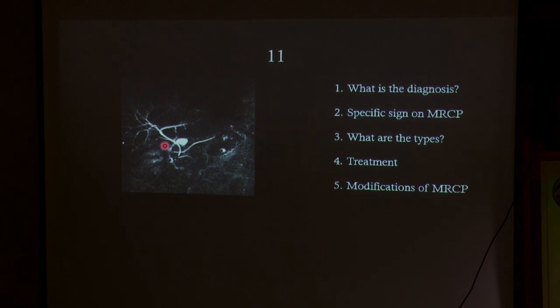So the next case, I provided an MRCP image. What is the diagnosis? What is the specific sign you are seeing on MRCP here? Yes, be loud. What is the diagnosis? Yes, it is pancreas divisum. Good. It is a case of classic pancreas divisum.